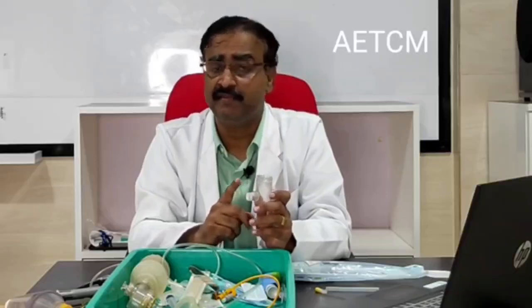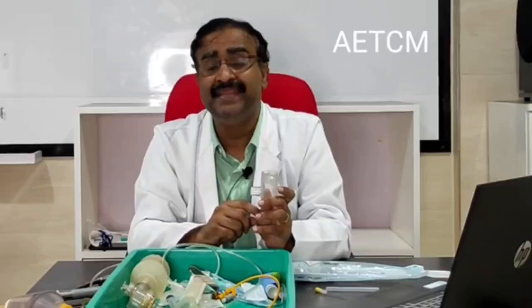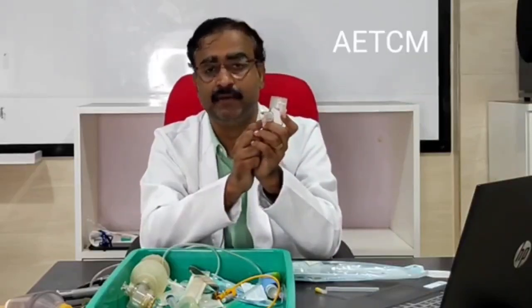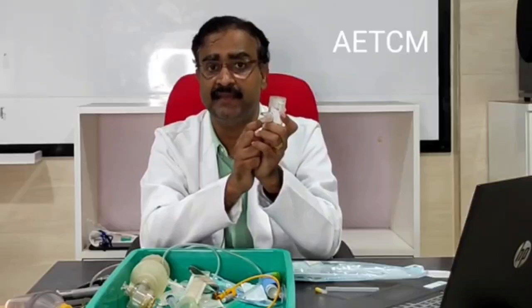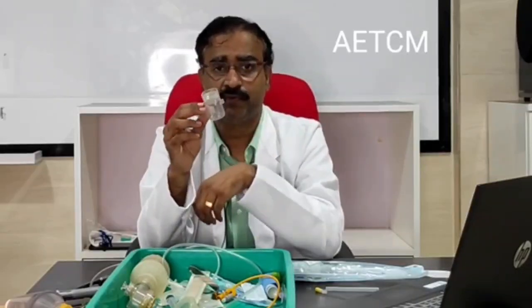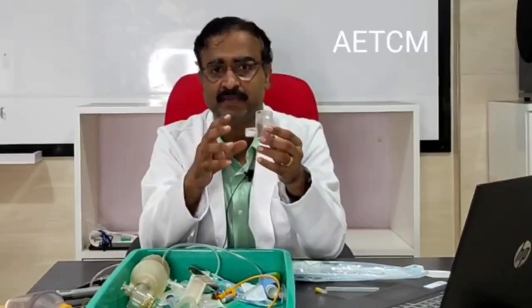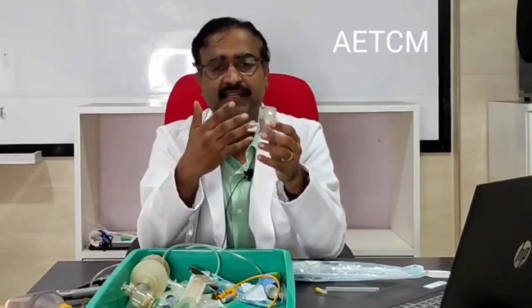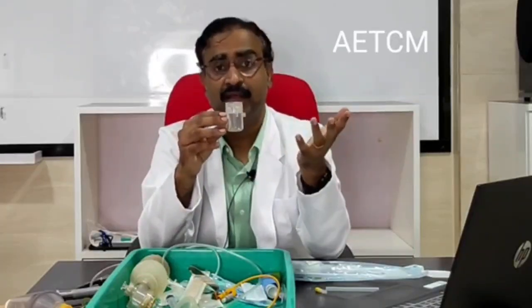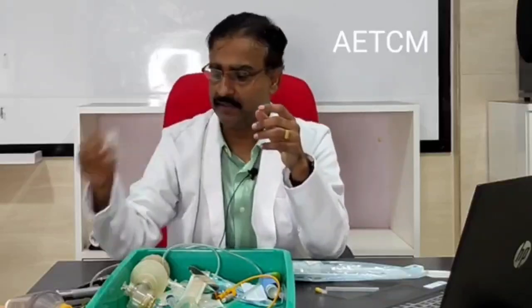For such a child, the device to be used is not a rotahaler but a metered dose inhaler. In a rotahaler, we use a DPI or dry powder inhaler device, so a rota cap is used. This is used for types of asthma, mostly chronic asthma. In acute asthma, the child gets tired out and will not be in a position to use this. An MDI would be a better option. So that is the use of a rotahaler.